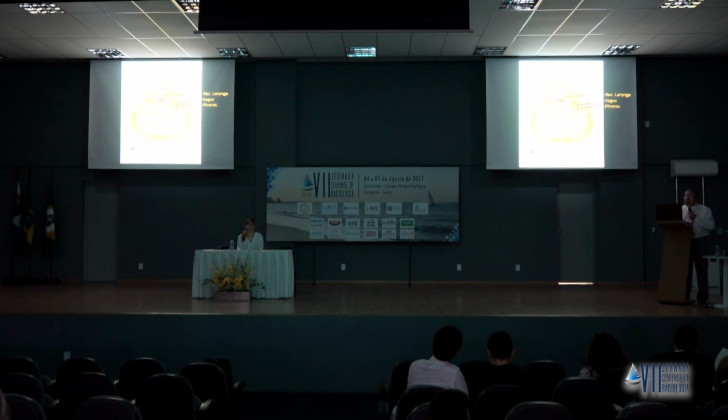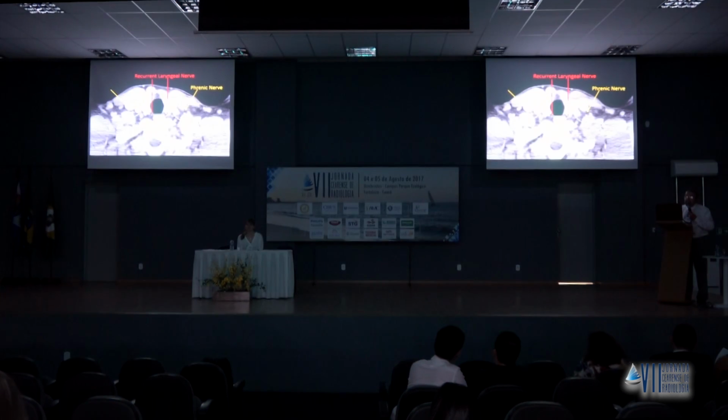And we have cases of brachial plexopathy, the upper brachial plexus. You remember C3, C4, C5 keeps the diaphragm alive. So when you have Erb's palsy with a traumatic lesion in the upper brachial plexus, you end up with diaphragmatic paralysis. And you can see that.